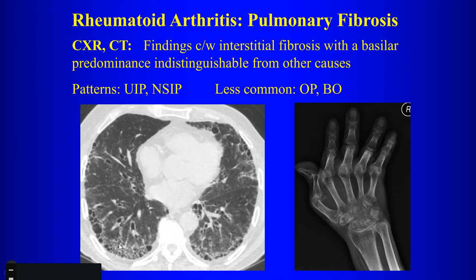Pulmonary fibrosis, so usually looks like UIP, right? Or it is UIP. Why do we call that UIP? Peripheral. Peripheral, what else? It's a base. Honeycombing. Honeycombing, yes. Peripheral reticular opacities with honeycombing and traction bronchiectasis. That's what we look for in UIP.